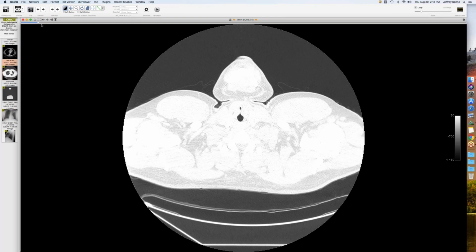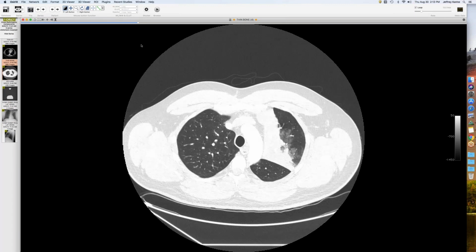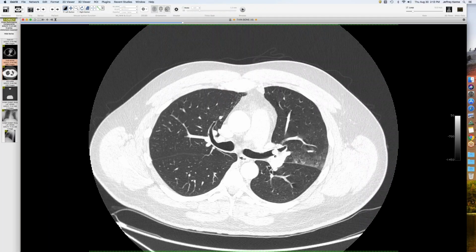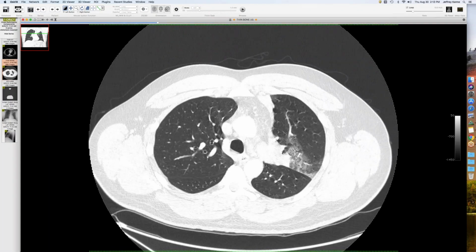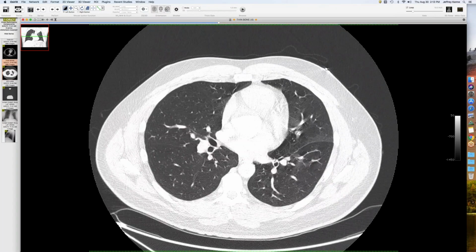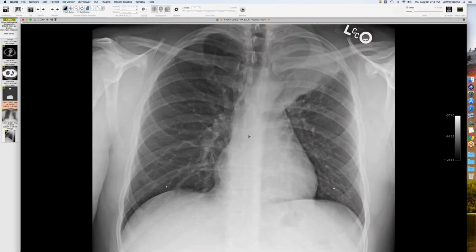So here's the CT scan. Howard showed a nice example of lingular obstructive collapse. This is left upper lobe collapse with lingular sparing. So this was a carcinoid, this little guy sitting right here. And it was presumably causing some sort of ball valve phenomenon, but just at the right angle so that at least the apical segment here is gone, but the lingula was preserved there. So in contrast to a typical left upper lobe collapse where you lose the left heart border interface and you often get that lucency around it, you don't see it in this case.